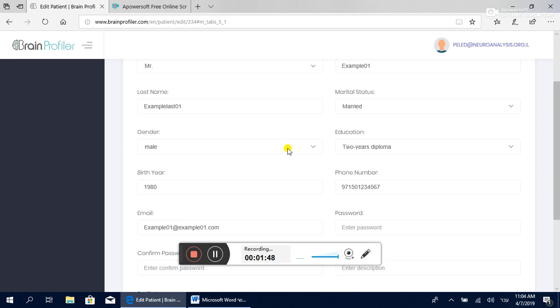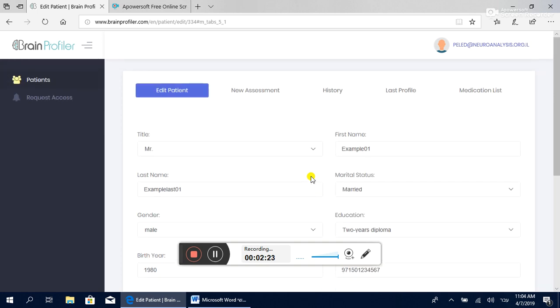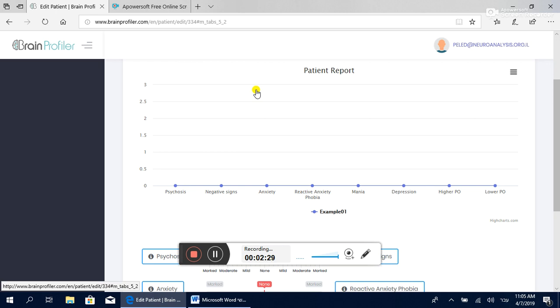One important thing to do is you have to enter contact information with the patient, because this platform will also collect information from the complaints of the patient and put them on this program. So you have to give a phone number of the patient and give him a specific password, and he will use this password in order to download the smartphone and iPhone application. Once you have concluded the patient registration, you move to the assessment of the patient.